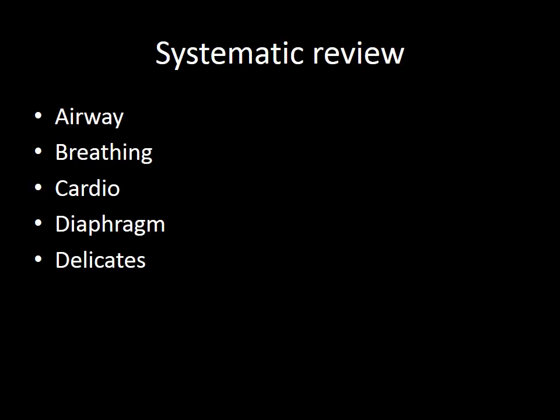A useful system is ABCDD: airway, breathing, cardio, diaphragm and delicates. Also comment on man-made abnormalities, for example lines, pacemakers or a nasogastric tube.